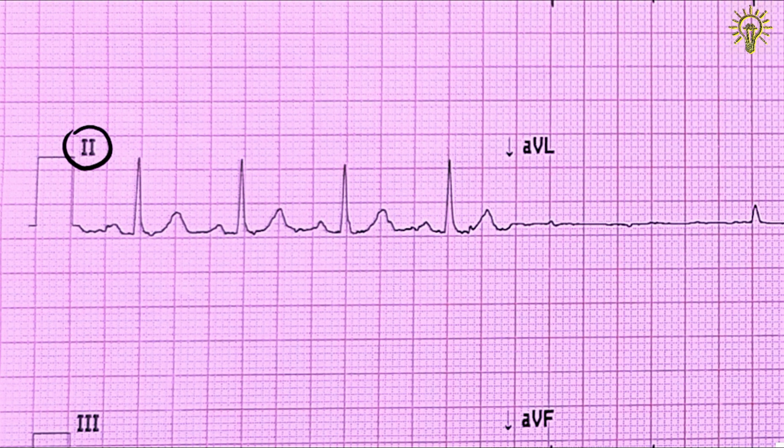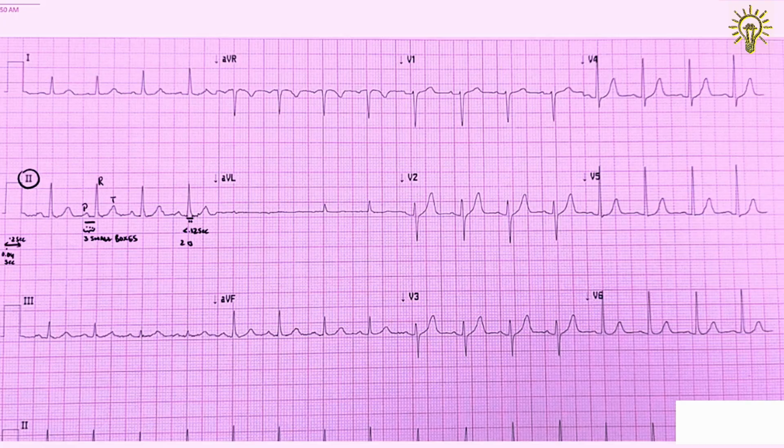In conclusion, coming back to the 12-lead ECG shown in the beginning of this video, we have seen the P wave, QRS complex, T wave. The PR interval here is almost 3 small boxes, so around 0.12 seconds, which is in normal range. The QRS complex is barely 2 dots wide, meaning it is a narrow QRS, meaning the depolarization wave followed the usual normal conduction pathway. The blue highlighted P wave is negative in AVR, which is normal.